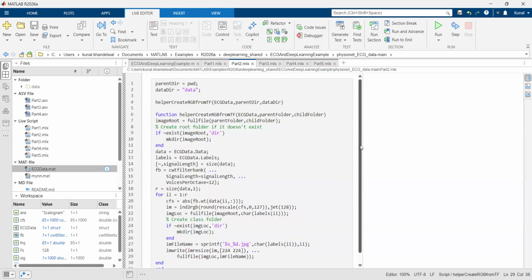Now plotting one ECG signal is cool, but if we have thousands of them, and if you have to use it for a deep learning model, then this will be a tedious task. And doing this manually will destroy your sanity. So today we are building a very fast MATLAB automation script.